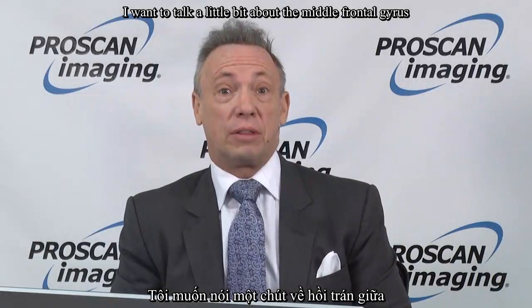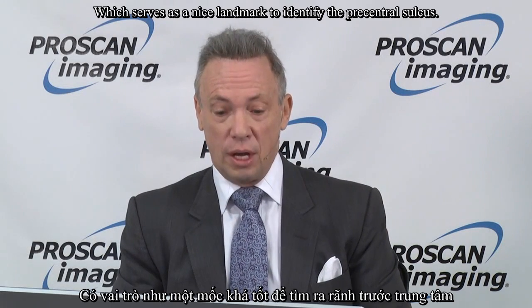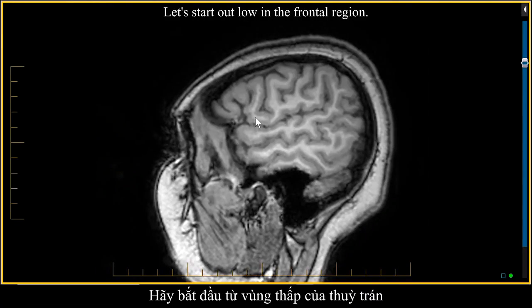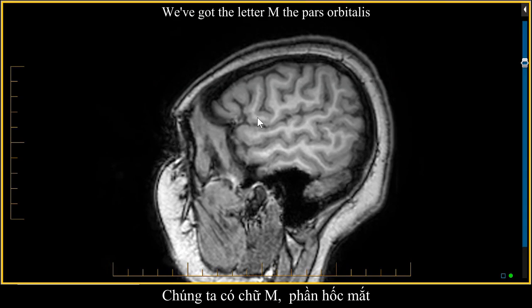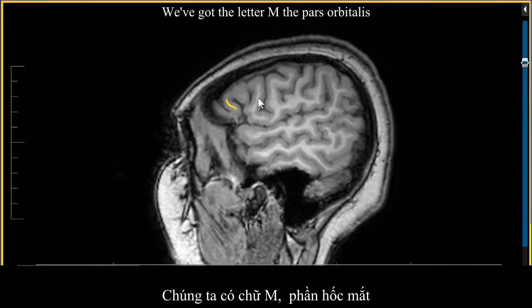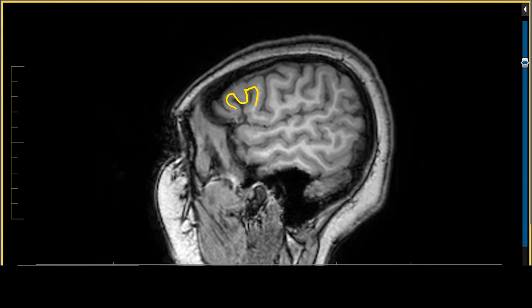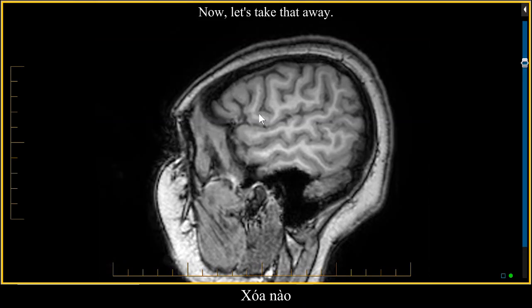I want to talk a little bit about the middle frontal gyrus, which serves as a nice landmark to identify the precentral sulcus. Let's start out down low in the frontal region. We've got the letter M, the pars orbitalis, the pars triangularis, and then the pars opercularis. Now let's take that away. That's the inferior frontal gyrus.